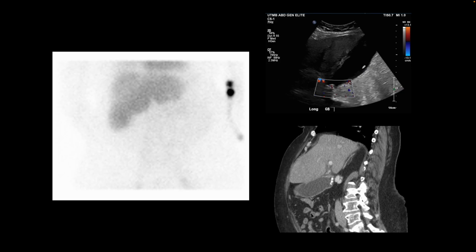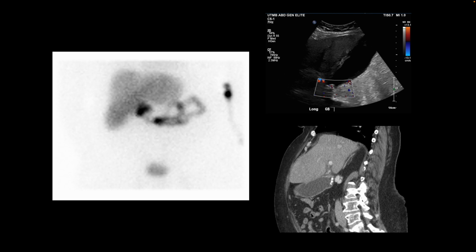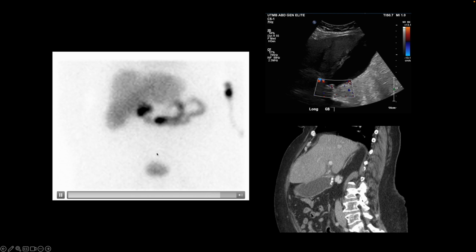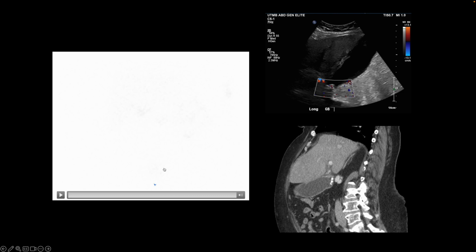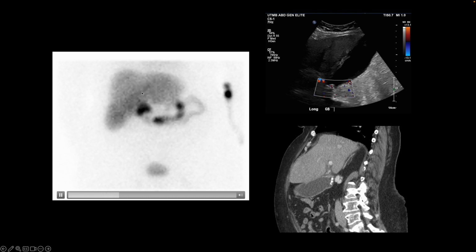Here is a patient who presented with right upper quadrant abdominal pain, and a HIDA scan was performed to see if they have acute cholecystitis. And so as we look at the cine, we find that the liver takes up the radiopharmaceutical, excretes it into the small bowel. There is some excretion from the kidneys into the bladder as well. We see some infiltration at the site of injection in the left antecubital fossa. And as we follow the tracer, we find that there is a focal uptake right there where the cystic duct takes off from the CBD.